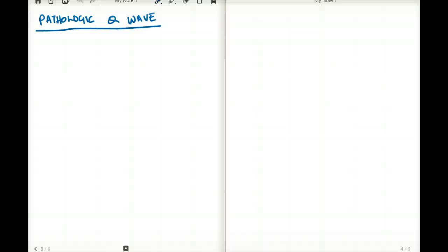In this video, I'll be talking about the pathologic Q wave. The reason I'm calling it pathologic is because we obviously see a Q wave in a normal EKG, and then there is a pathologic Q wave, which we see during MI. Before we understand the pathologic Q wave, we first have to understand what exactly the normal Q wave is, and then we'll talk about the pathologic Q wave. So let's get right into it.